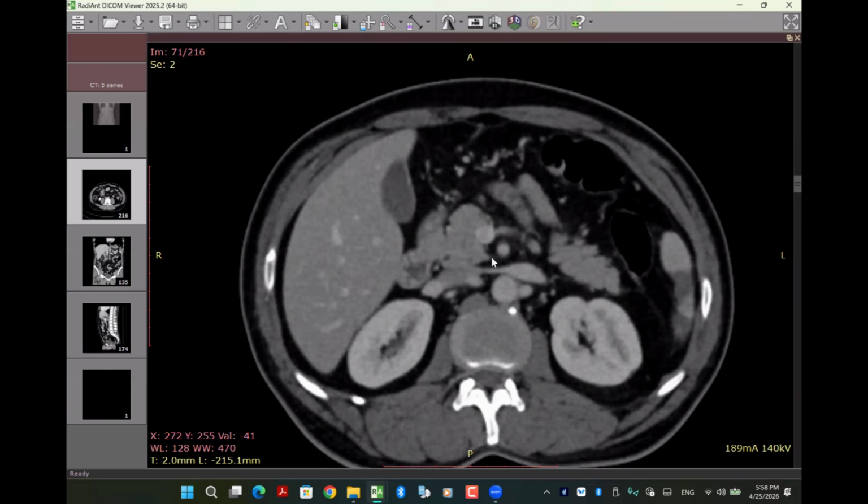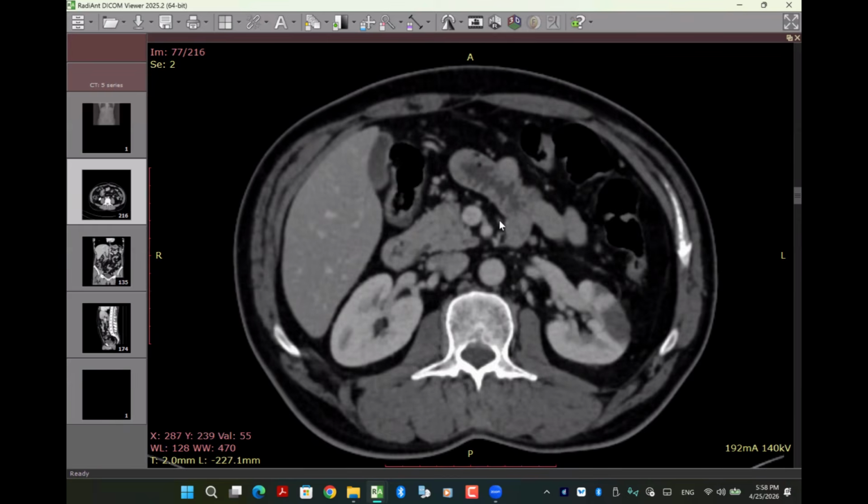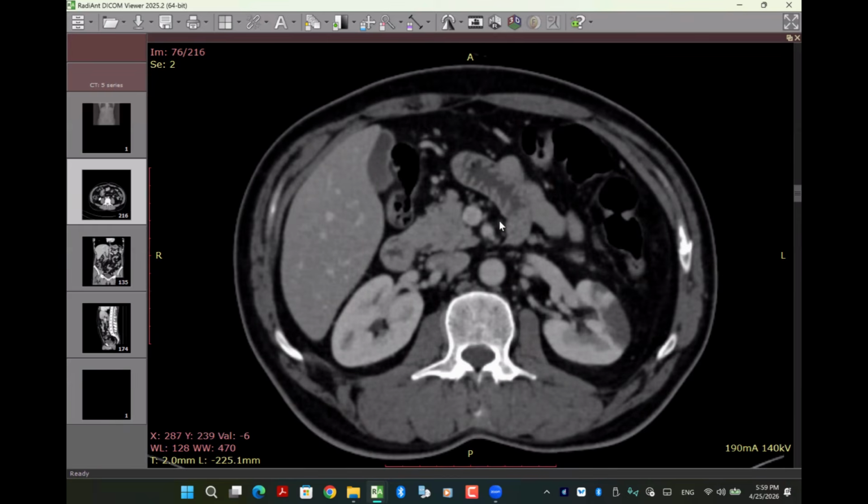Actually, how do you differentiate this one from the previous session's cases, like infection? Can you state for me at least one or two clues for this one? Yeah, I would like to differentiate from a close differential, because it is a hypodensity having a triangular appearance, and it is not leading to any stranding in the perirenal fat, and no affection of the perirenal fascia is noted. Plus the perirenal area is very clean. It is not showing any stranding, and there are hypodensities which are triangular. Additionally, there are splenic same-looking lesions as well. So I would like to keep a differential of infarct first.